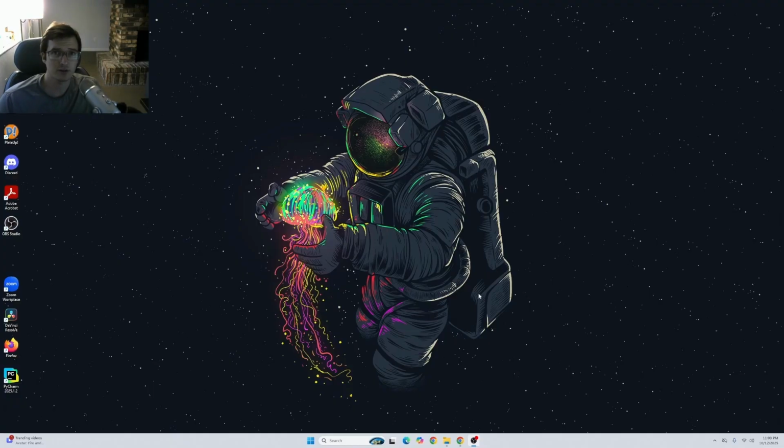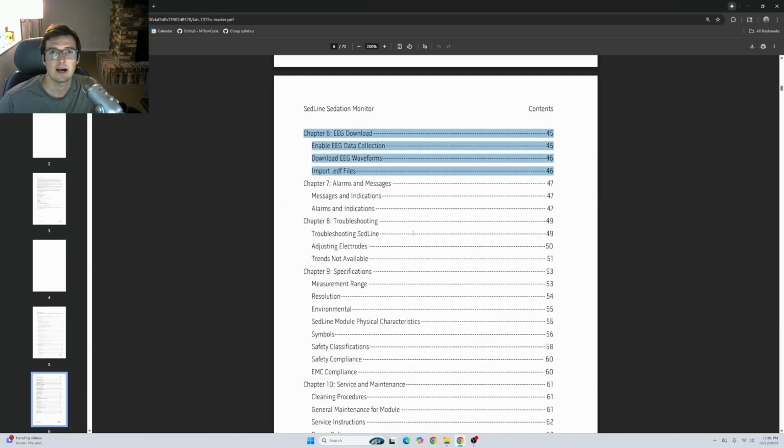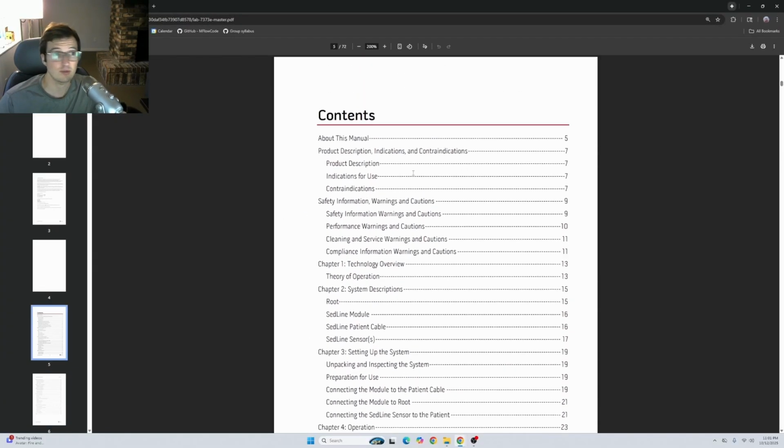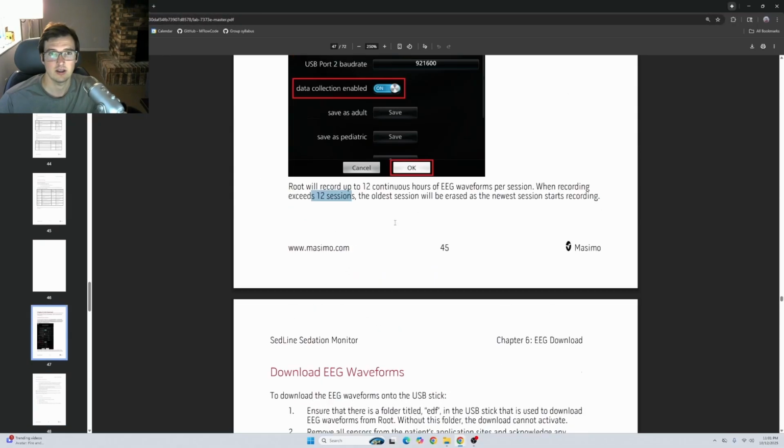And in this video, as part of our documentation, I wanted to show you how you would actually go about downloading data off of a Masimo SedLine. So just to quickly refer you to the documentation, this is the Masimo SedLine user manual. You can find this online very easily. And here in the contents, you can see that as of the time of recording, which is October 2025, there is a chapter on EEG download, which has all this information that you will want.